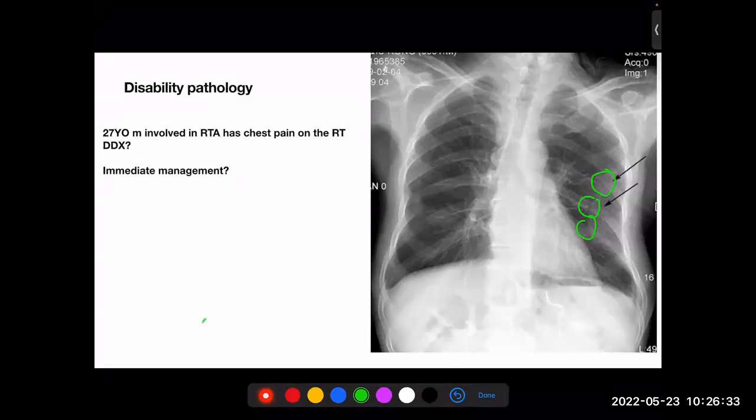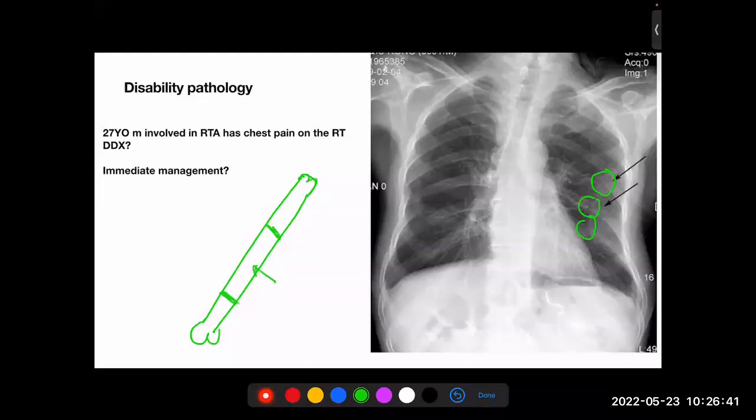If this is a bone, if you have a segmental fracture, what happens is the bone is fractured here and is also fractured here, so that this segment is sitting on its own. Sir, I'm just seeing one fracture here. I'm not seeing a segmental fracture. A segmental fracture of the rib will be a rib breaking at two different places, so that this aspect moves on its own.